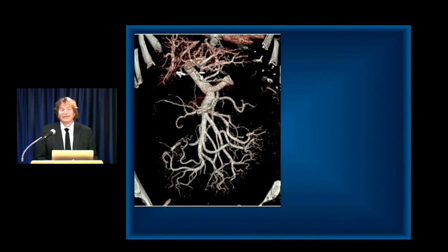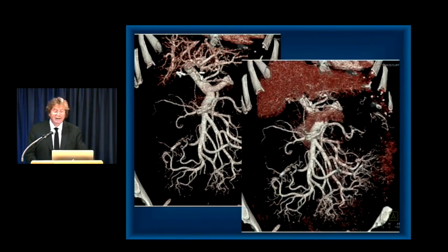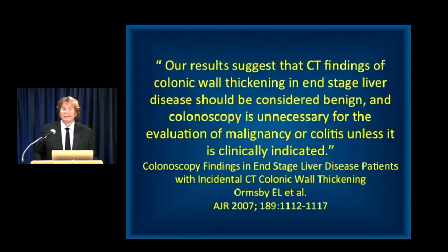And again, looking at the vessels here, yes, the portal vein and splenic vein and SMV are all patent, but you can see the portal hypertension with the very large collateral pathways. Now, in this case, I showed you the small bowel was thickened, but you also can see large bowel thickening. And one of the important things to know is it's a great pitfall. You commonly see bowel wall thickening, let's say large bowel, and you're thinking colitis. Well, if you have end-stage liver disease or just severe liver disease, if you see right colon thickening, I always say it's consistent with changes related to the patient's cirrhosis.